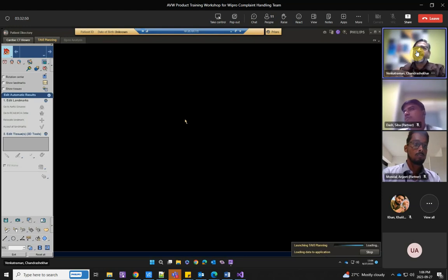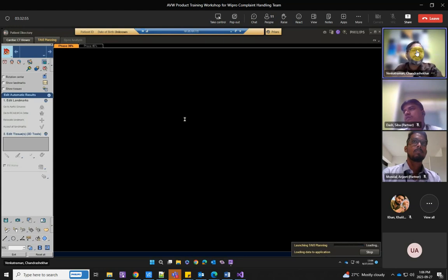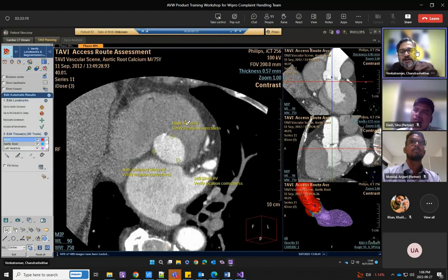That's where we have to place it, because if at that point itself there is any kind of defect, we have to do some treatment at that point where the blood flow starts. The aortic arch is the one which gives blood to the lower part of the body through the descending aorta, and there is some branching which happens even to the upper part of the body. So if there is any problem over here, any blockages, we have to place some catheters and stents over there.